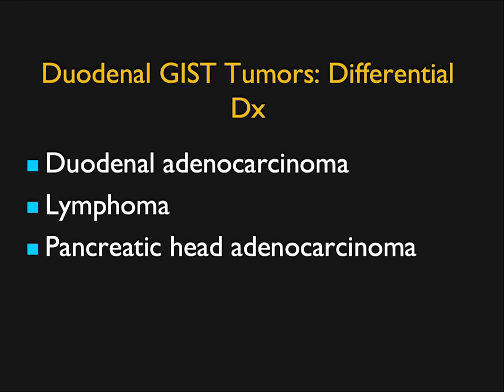Now we think about duodenal tumors. I mentioned, again, it could be pancreatic cancer, but adenocarcinoma and lymphoma are all possibilities. Duodenal adenocarcinoma. So I think at times you need to be very careful. Usually I can be perfect in coming up with a diagnosis in this case by knowing what the lesions look like in terms of the masses, particularly seen in carcinoid, which makes it easy. But again, it's something to think about.